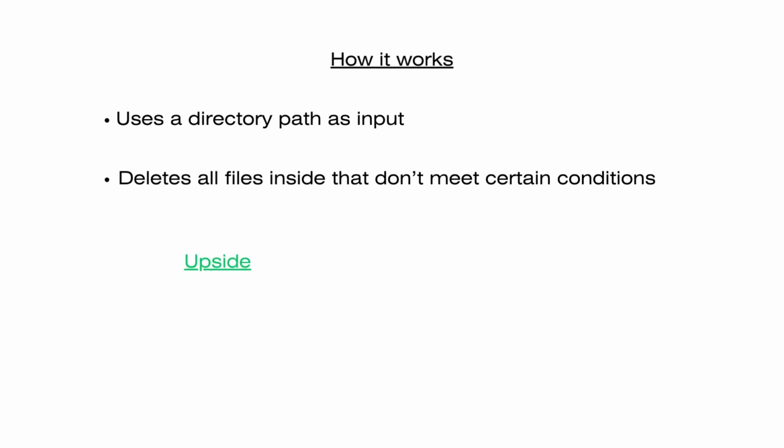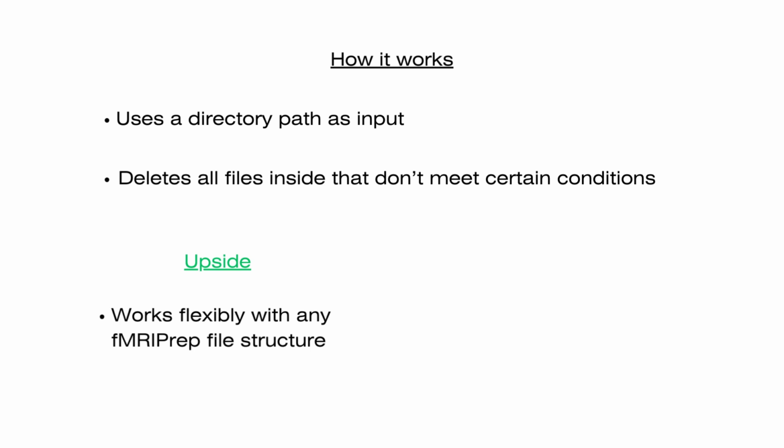The upside is you can use this script regardless of how your fMRIPrep output is structured. It might be that you have a derivatives folder that contains all the output files for your sample and a separate scratch folder that contains all the working directory files. Alternatively, you might have a single folder for each subject which contains all of their output and working directory files.